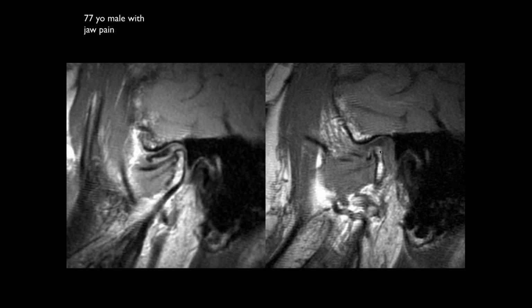So the differential here is, the reason why you don't have adequate anterior translation here is not the usual reason, that you have a big fragment of the disc that's not moving and isn't capturing, because you're actually capturing it. So here, either the patient is not opening their mouth, maybe because of pain, or you have adhesions in the joint space, which limits translation.